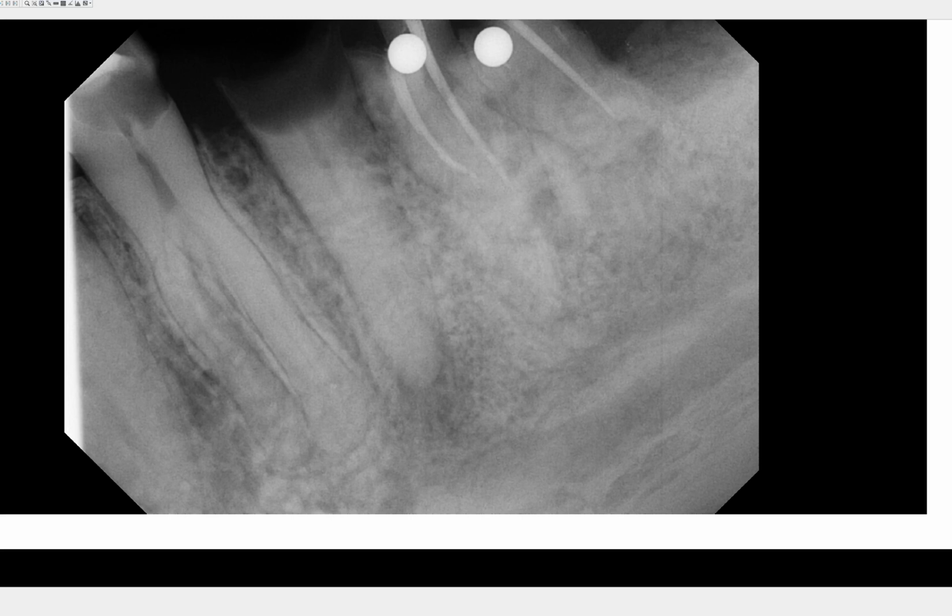Let's take a moment to look at this periapical radiograph. In today's video, I'm going to show you why it is so important to recognize anatomic variations before your implant treatment planning. So looking at this periapical radiograph, we have multiple teeth that are grossly decayed with missing crowns and large carious lesions. And again, how confidently can we identify the mandibular canal?